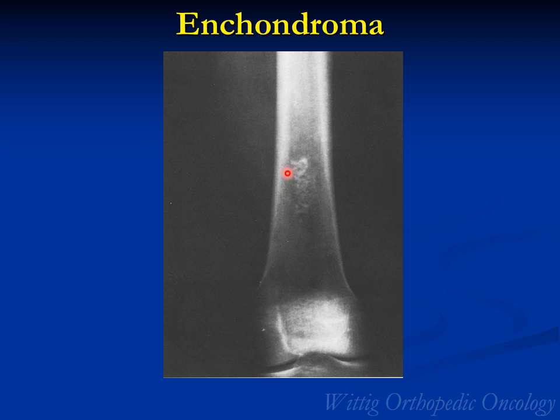And you can see here the calcifications. If you look very closely, they occur in a ring and arc-like manner.